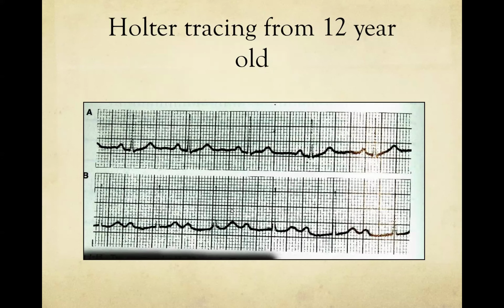So if you had said that you feel this is sinus rhythm without conduction, that this is just some kind of ventricular escape rate, I certainly could not say you're wrong. So you actually could get the question right either way. But I think this is probably conduction with just a very long PR interval. Anybody have any ideas on why someone who seems to be conducting with a sort of top normal PR interval at one time has at other times this very gigantic PR interval?